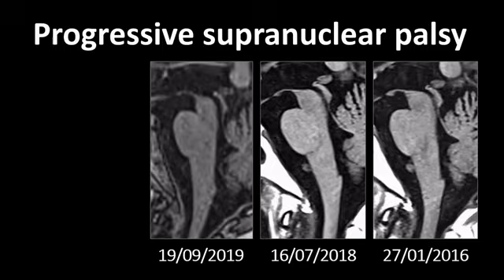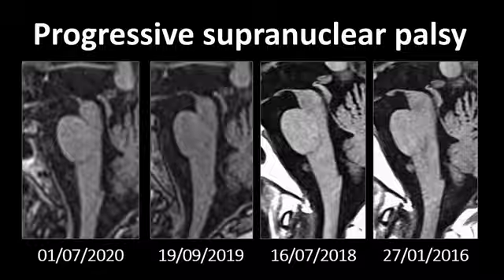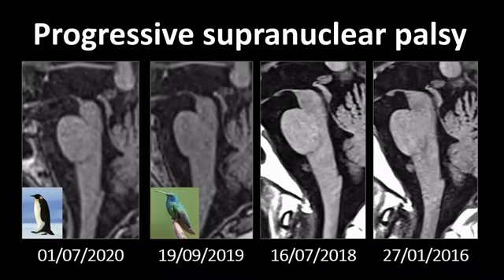Now, another year later, the midbrain has clearly become too small, clearly atrophic, and this is also the case on the follow-up MRI 1 year later. So if you look at the initial images of 2016 and the final images of 2020, you clearly see a difference. And it's only in those last two images that you could call this a hummingbird sign or a penguin sign. But admittedly, it's difficult.